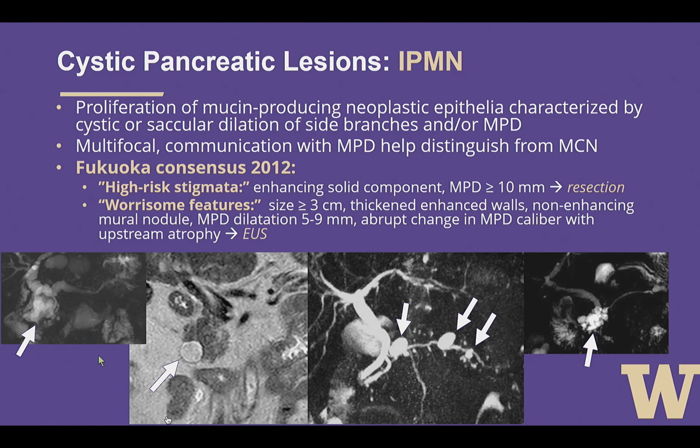You can see that IPMNs come in a variety of different forms. They can be multilocular with main duct dilation, they can be unilocular and unifocal, they can be multifocal without main duct dilation, or they can be multilocular without main duct dilation.